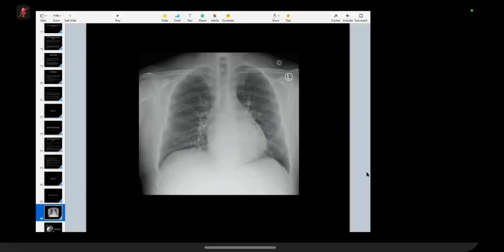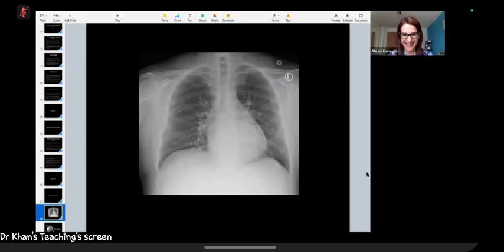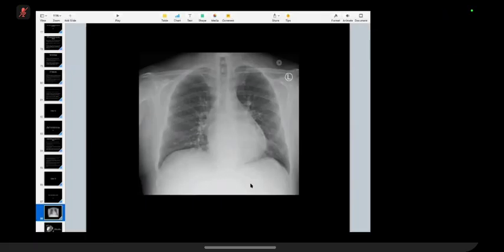I can't assess for interstitial lines with the image quality that I'm currently getting. But I agree with that. Yeah, well done. So in this context I would want to further evaluate with contrast-enhanced CT.